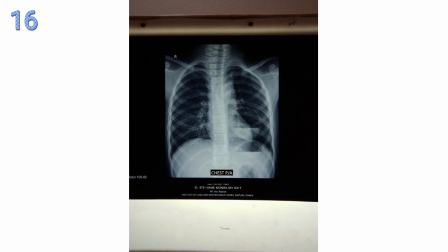Here you can see air-fluid level inside a cavity in left lung. So diagnosis was left-sided lung abscess.